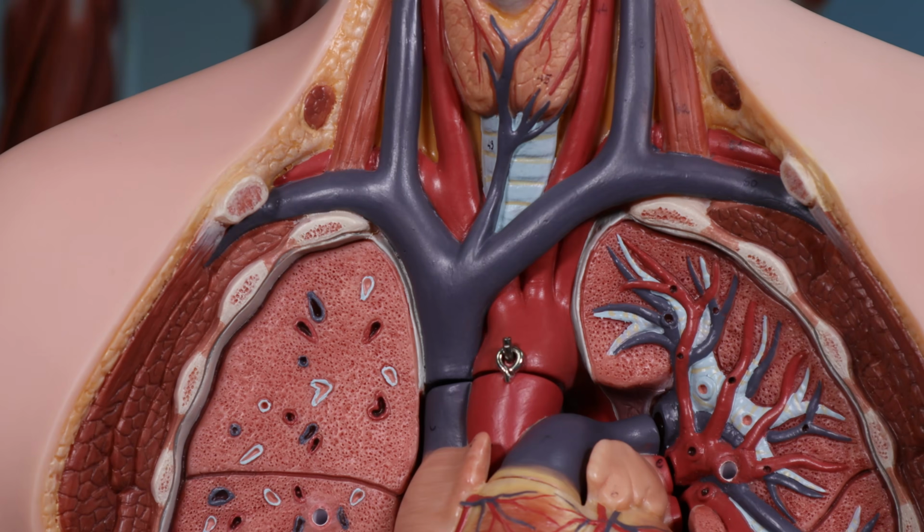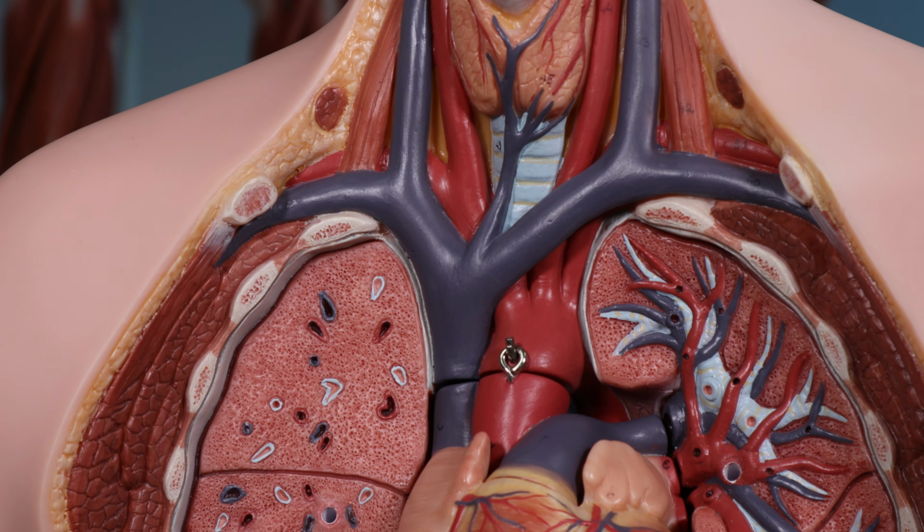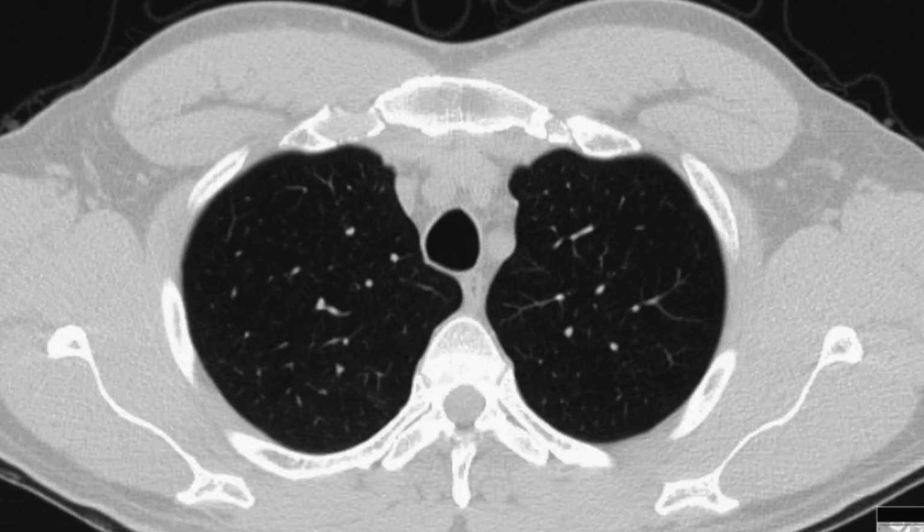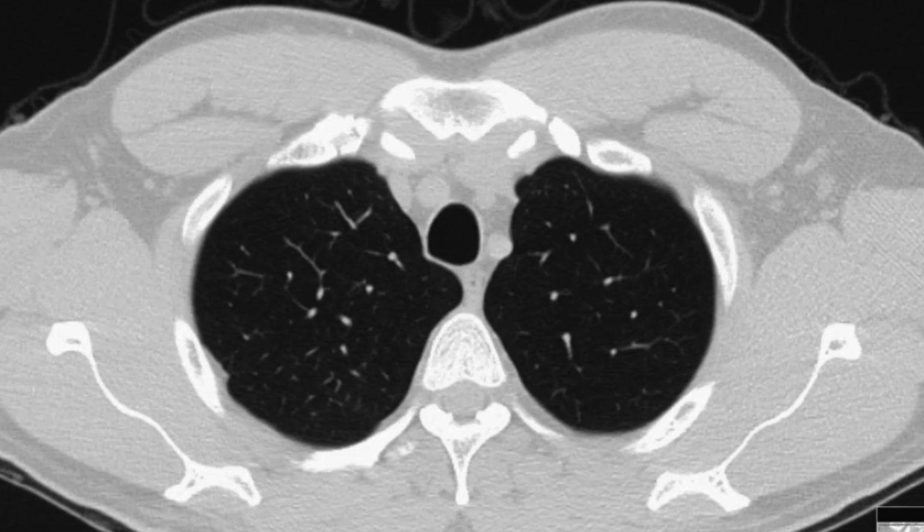Now, the superior vena cava is a little bit over to the right side, because it's going into the right side of the heart, which means that the left brachiocephalic vein is going to have to come across further than the right brachiocephalic vein. Let's bear that in mind. Then let's also bear in mind that the veins are more superficial than the arteries. And, you know, they're a little bit squidgy in shape, a little bit less round. The arteries then are rounder.